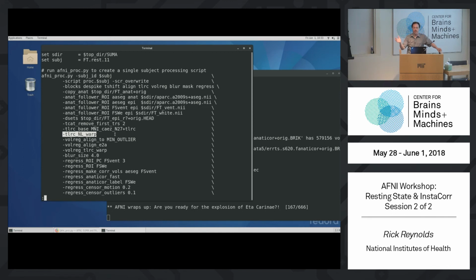It's trivial to make probability masks for all of the ROIs. You can see how well the ROIs overlap across your subjects. So you can combine these, make your own atlas. You can make your own FreeSurfer atlas with a maximum probability map. Very easy to do. That's essentially how the Desai atlases were made. So some options to ponder. Any last questions?